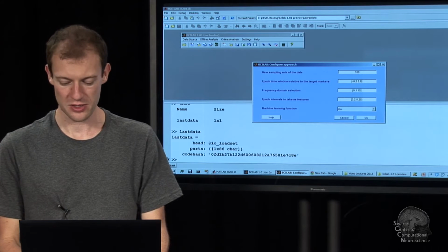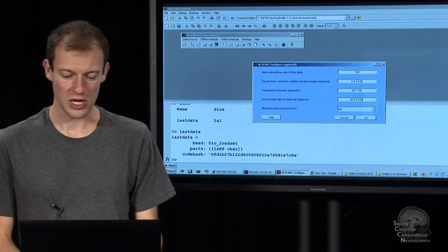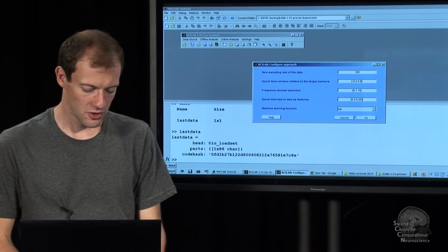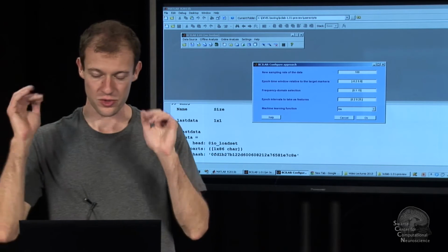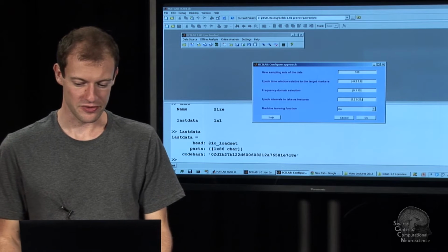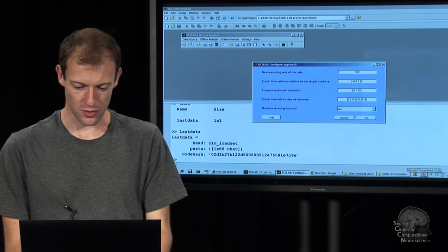That's not going to be enough. I want to basically cover the majority of this epoch with a few time windows. But I don't want to use too many because that would be too many parameters to learn, the so-called curse of dimensionality that LDA is so plagued by, which is our default classifier. So I just use 5 or 6. So I go on 0.25 to 0.3.